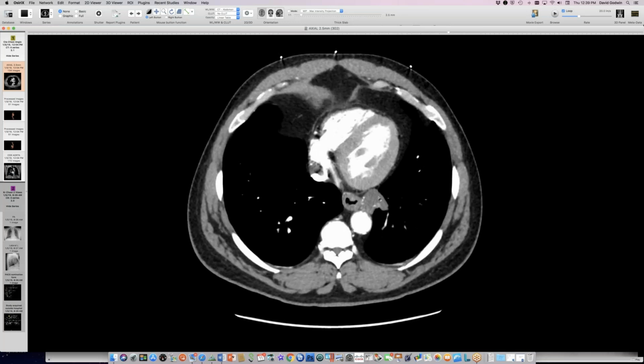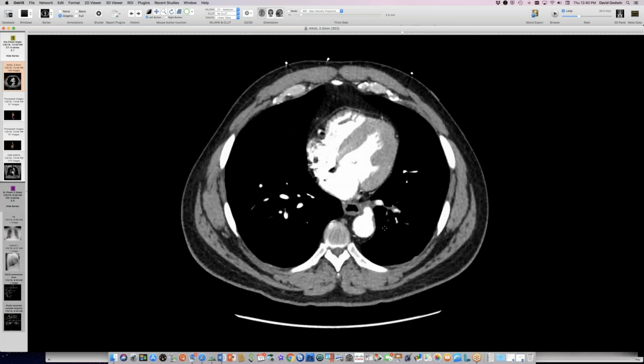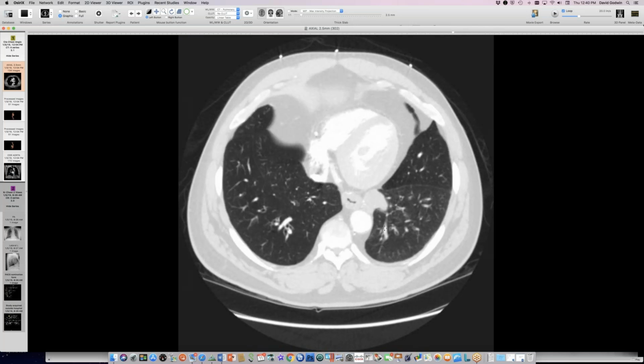I didn't measure. Let me just see what CT numbers are here to see if you could say that this is mucus. No, it's a mean of 34, so it's lowish for soft tissue. It may be inspissated mucus or something, or dry, concentrated mucus giving us CT values along those lines. So, a fairly small sequestration, but a big artery, that's just fine for sequestration. Even though we're not seeing classic big findings, it still fits with sequestration, and this emphysematous component is probably part of it. Yep, a little bronchiolitis obliterans focally with a little hyperinflation.